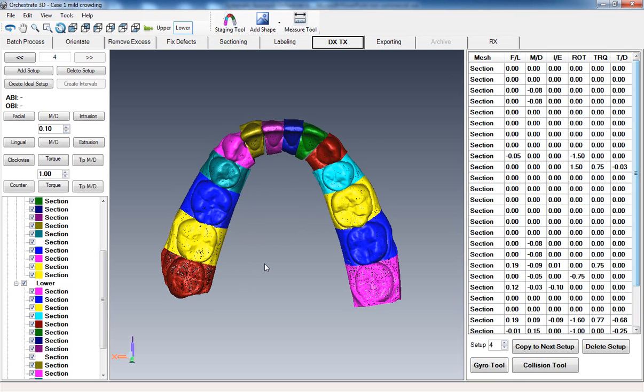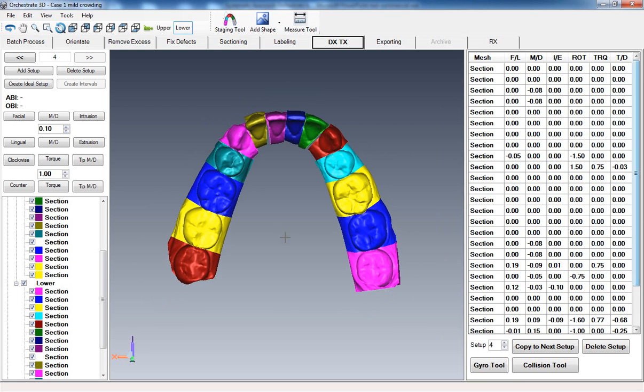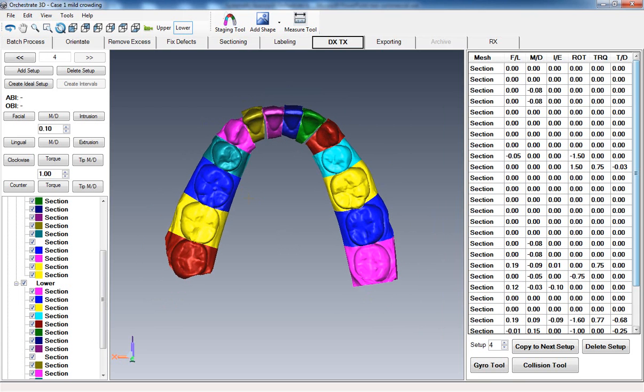Now, what I would do though is I would not have all 4 of these models printed at one time. Or actually, in an easy case like this, I probably would. However, I like to take my case to, you can see this is not perfect. It's close, but it's not perfect. What I like to do is have my patient wear these 4 appliances, have them come back, and then when the patient comes in, do a last little bit of tweaking based upon what I see clinically in the patient's mouth. If you do that, then you get very nice, perfect results every time. Okay? So hopefully that makes sense, and I look forward to seeing you in case workup number 2.